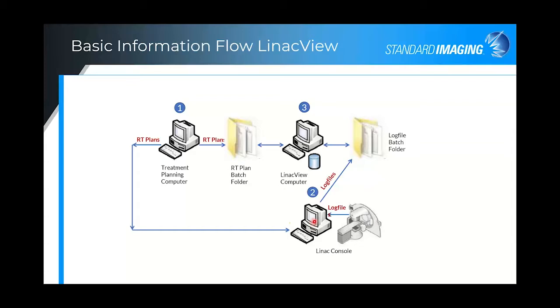And then the log files are monitored by LinacView, again an automated process, such that any RTPlan that has been picked up by LinacView will automatically associate and analyze the log files that are automatically picked up from the Linac.